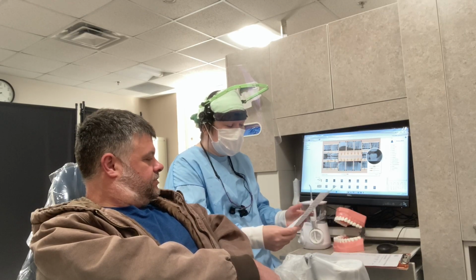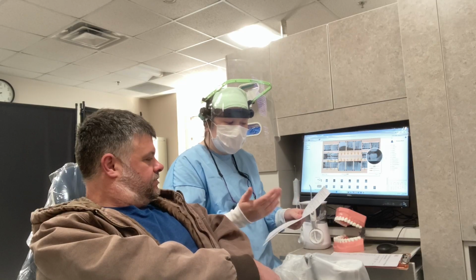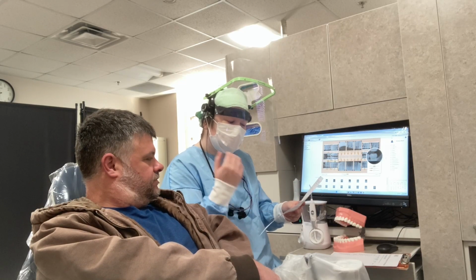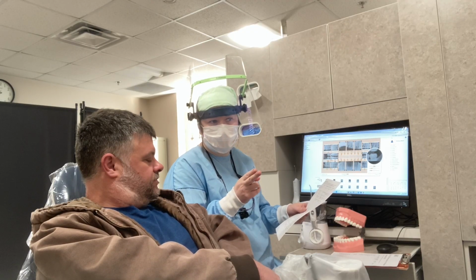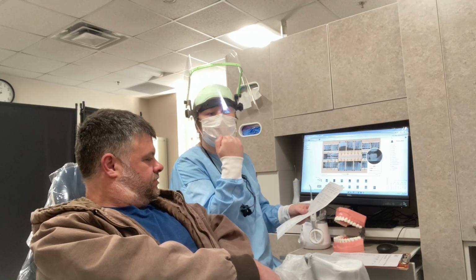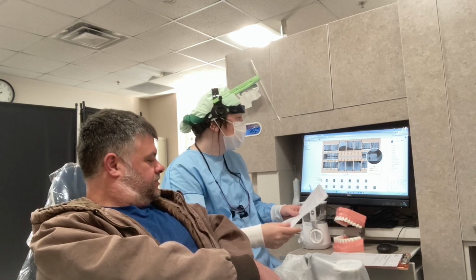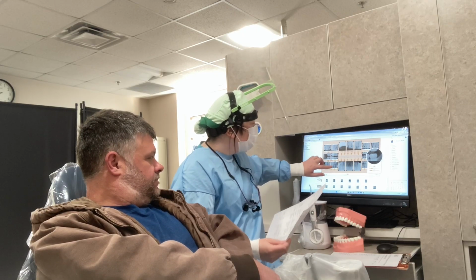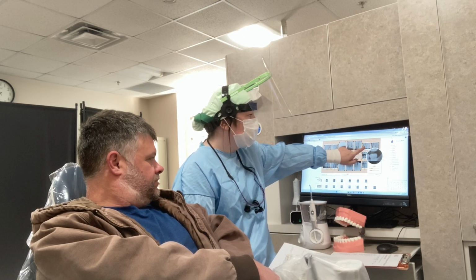And so what that's indicating, we have kind of a breakdown on the back, is we had greater than or equal to 5 millimeter depths. We also had a little bit of vertical bone loss. So there's vertical and horizontal bone loss. Horizontal is when the bone just drops straight down, and that's mostly what we see in your images, so that's good. There's little bits of vertical. What I see is if it's completely black like this, that bone's lost on both sides.